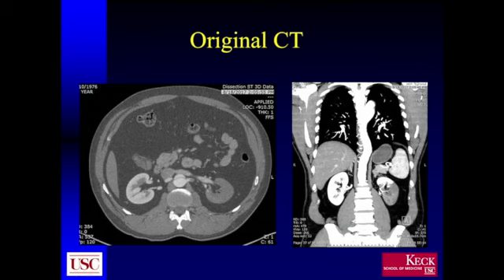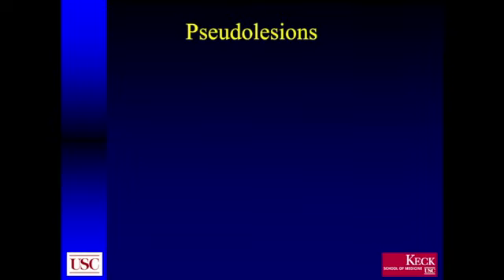This is that single vessel that you could see going to the upper pole that we showed on the recent ultrasound. So again, there are various vascular abnormalities, such as infarcts in this particular case, where contrast ultrasound may occasionally be of value for further clarification.